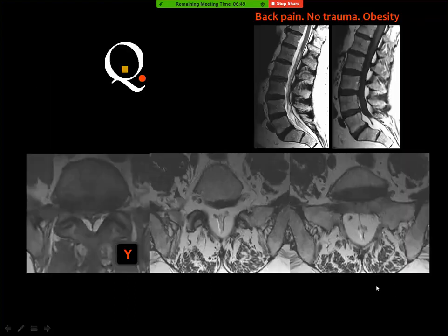What do you think of this? Low cord, due to filum terminale, tethered cord. Fatty filum terminale. No, this is the cord which is normally terminating here. Lipoma of the filum terminale? Lipoma of the filum will appear as a line of increased signal in T1 along the filum. This is a lipoma, but not of the filum, and it is located in the spinal canal.